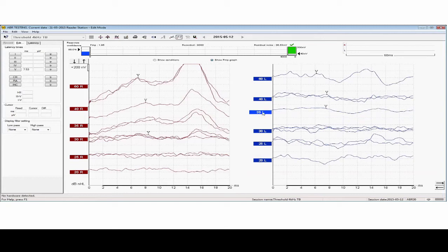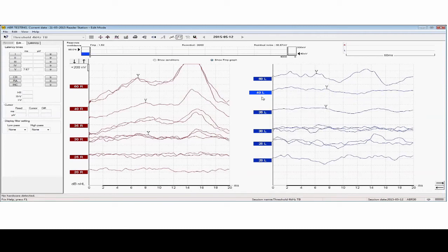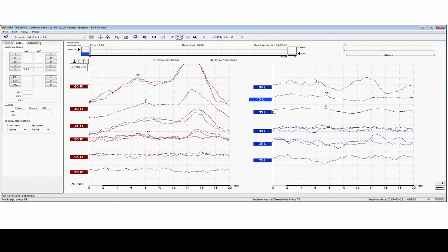So if the person had decided to just measure longer and then measure until the noise is really low enough, then the curve looks much nicer, and I'm sure that the patterns are more easily recognized by adding them together. These measurements will never become very beautiful because they were measured in very poor circumstances, but my point is that they could have used residual noise and FMP to become more comfortable.